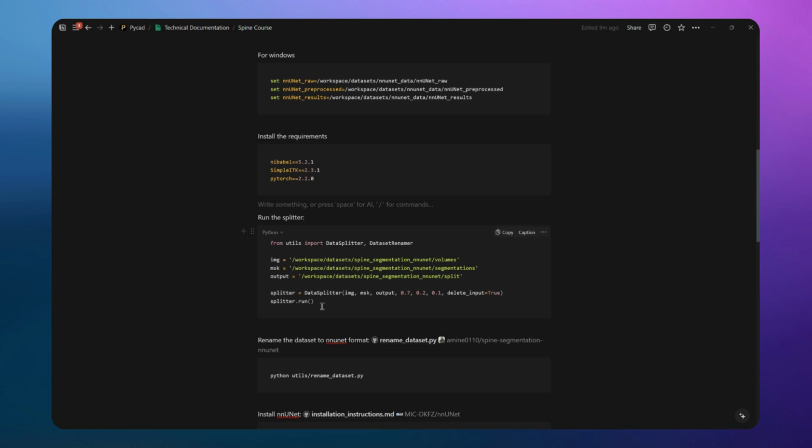So what I recommend, whenever you do the split, is to do only two splits, one for the training and the other for the testing, and put the maximum data in the training, because the ones that you keep for testing will be left for testing only and not used for something else. This is what I recommend, but for sure you can do whatever you want with your dataset.